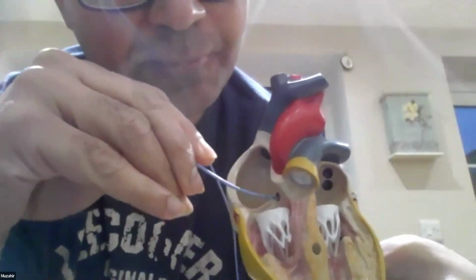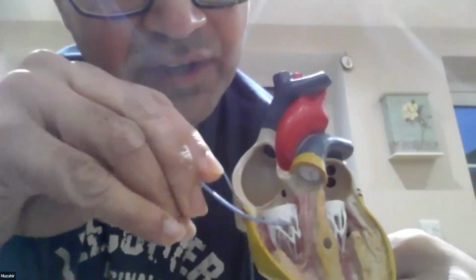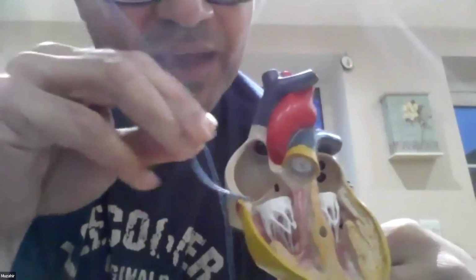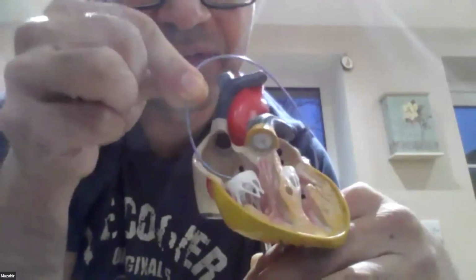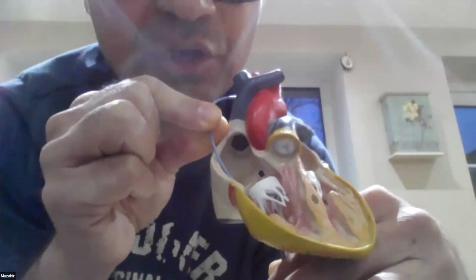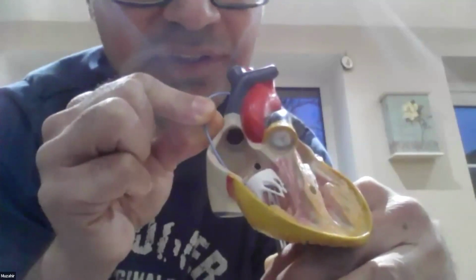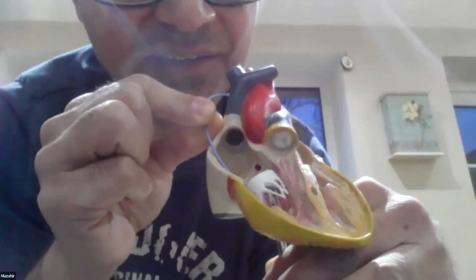If you look at the coronary sinus in this model, it is posterior to the tricuspid valve, and that's quite important to understand, because as you go from the superior aspect, coming from the left-hand side generally, the idea is to place your catheter first into the right ventricle. With an EP catheter connected to the mapping system, you'll be able to see predominantly right ventricular signals. If any of you have joined on the foundation course, you might be aware of what we've discussed when we see these signals.